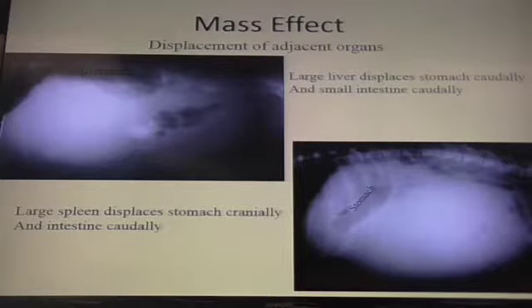If you look at this image, you go, okay, that doesn't look right. But let's start recognizing what you do see. First of all, cranial dorsal, you see gas. Well, what's located cranial dorsal? Fundus of the stomach. So there's gas in the fundus of the stomach.